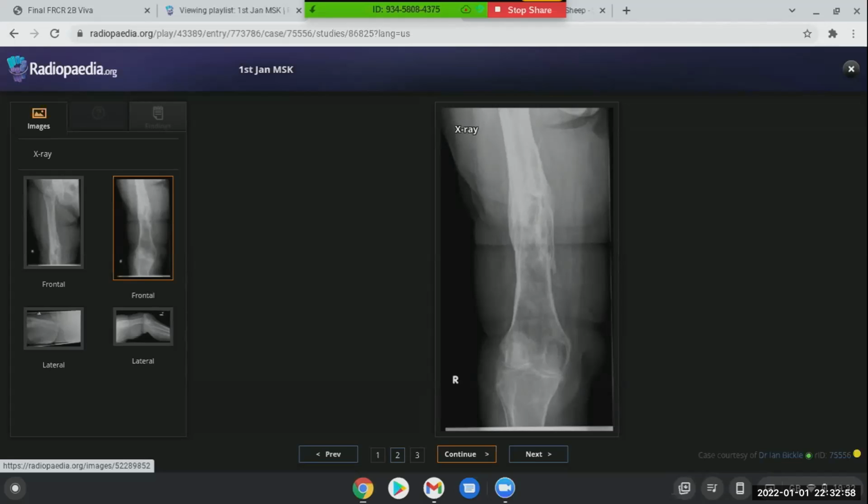And considering that the patient came with a discharging sinus at the mid-thigh, I would consider the possibility of an inflammatory or infectious process like Brodie's abscess, osteomyelitis spectrum. So I would check if the patient has a previous history of osteomyelitis before. I would request also, of course, after discussing the case with the referring physician, culture and sensitivity from the pus or from the discharge. So this is my differential diagnosis in this case, considering the age and the clinical presentation.